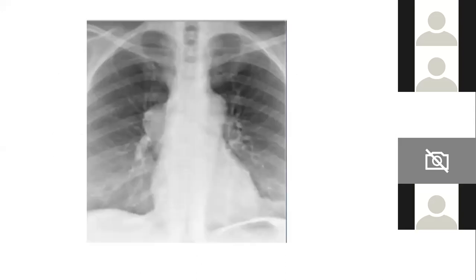Someone asks, why not posterior? So why posterior is what I ask, right? What are the findings that are telling you that it's in the posterior mediastinum? You can see the subcarinal angle is widened and the anterior structures are spared. So once you already have a localizer, why do you want to think about anything else? So don't go by just that obviously it is not arising from the pulmonary artery; it doesn't mean it's not in the middle mediastinum. Remember that.